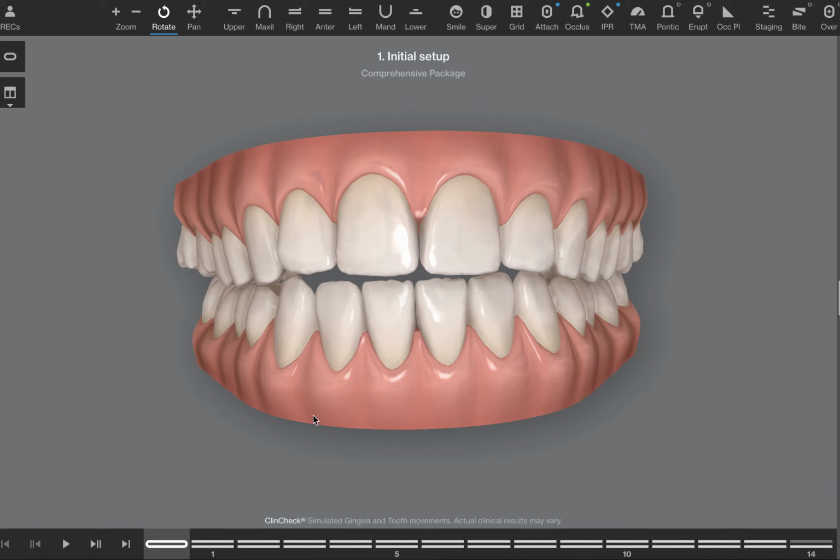I don't expect you to fully understand everything that I'm planning based upon that fact, but I'm building in what I think your biology is going to be based upon who you are, your age, so on and so forth. And I'm going to have the computer make trays according to what my estimated assessment is of your biology.